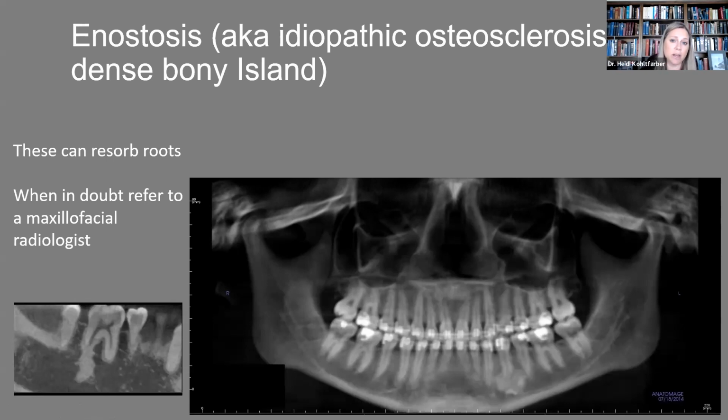And actually, you can find them anywhere throughout the skeletal bones. So they're not just unique to the oral cavity. In fact, many of the things that we see are not just unique to the oral cavity. You really see them throughout the whole body. And I think that's one of the beauties of radiology, is it really puts that whole patient care together.